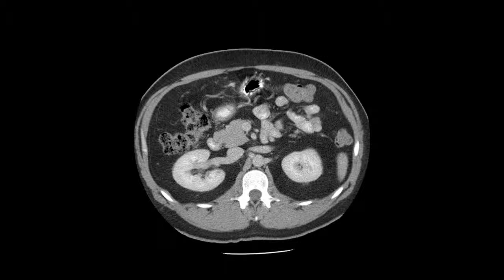All right, so again, right kidney, right renal vein. How do I know that? Because it's connected up to the inferior vena cava right here. Okay, or to here. Left kidney there, of course, and again, there's that stool that looks really dried out, so to speak. That would be the ascending colon.